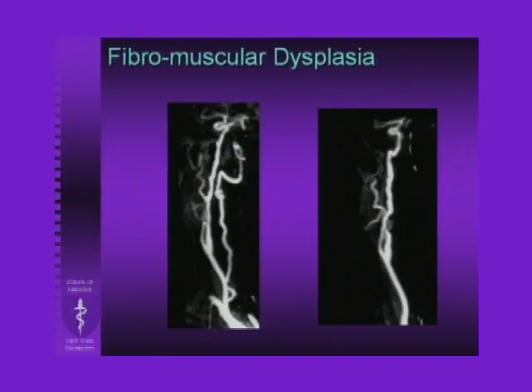One of the things that you can see on the contrast-enhanced study that you really couldn't see very well on the non-contrast study is fibromuscular dysplasia, which, as you know, is an abnormality of the media of the vessel where you get this beading of the vessel, as it's called, which you can actually see here. Because we're filling out the vessel better with the contrast, seeing the margin of the wall and the lumen better, we can actually detect this now.